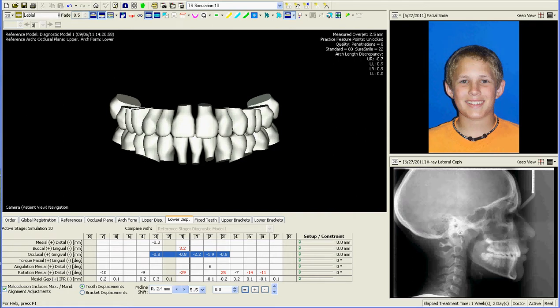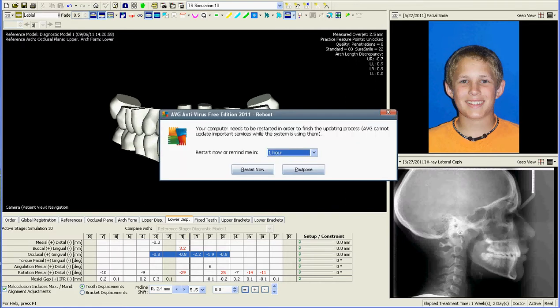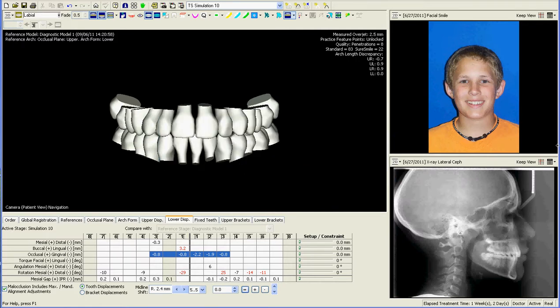Okay, Arndt, I'm setting this up to show you how to do this lingual setup with the bracket placement. First, you go ahead and do a simulation, just a rough one. It doesn't have to be perfect, but get the vertical. Don't worry about angulation too much, but get it done.